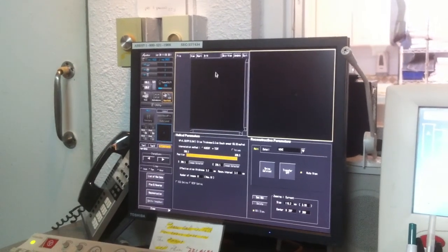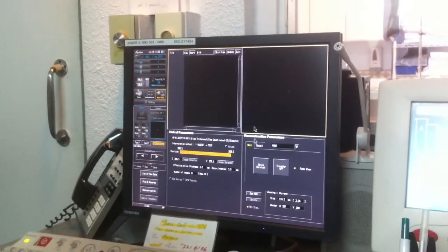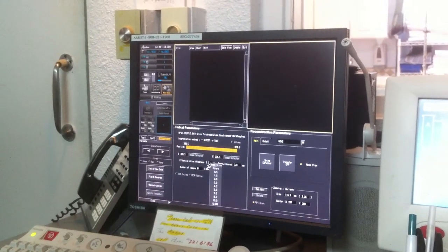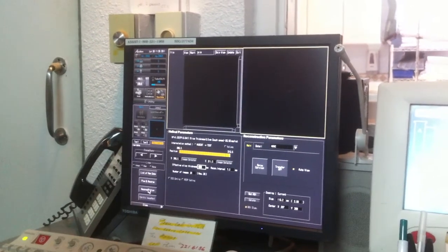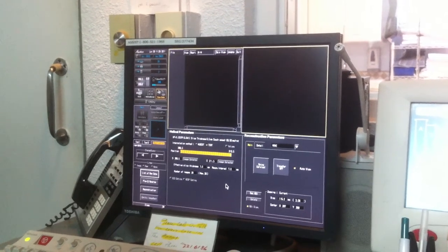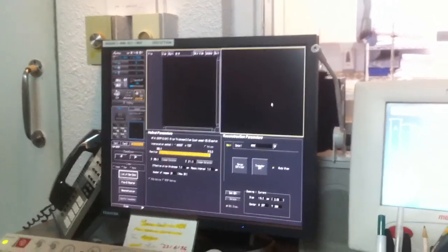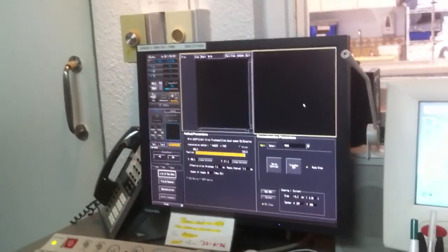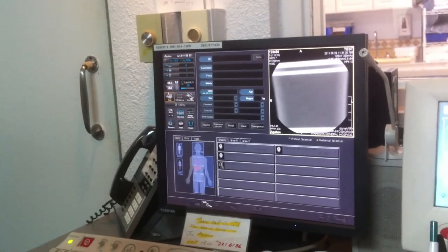But I don't have any images. I still can't tell. So what do I have to do? Generate some images and just do something thick like 7x7s. And then hit reconstruct. And then what should I do? We don't have to select which one is going into now because we already separated it. Right. You got to close out and go back and grab it, right? Right. Close out and then come back in.